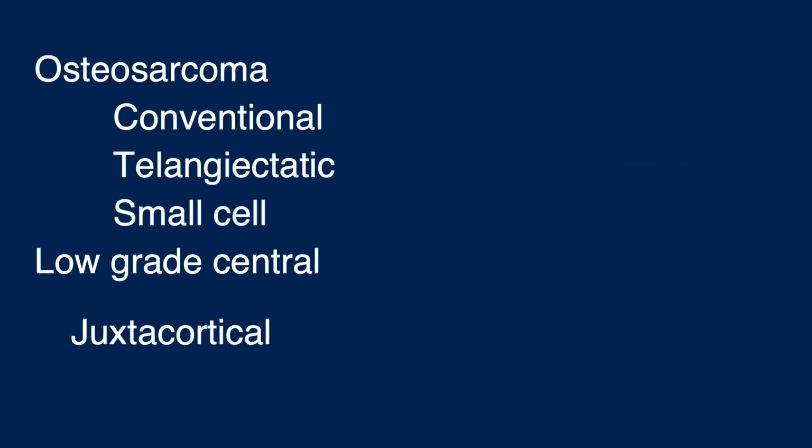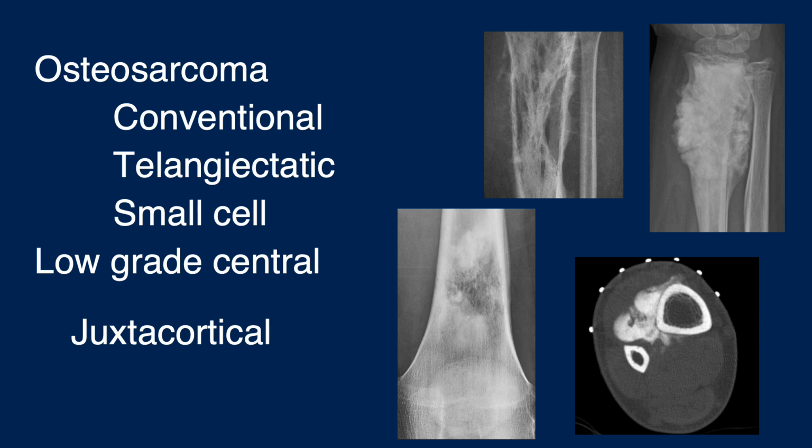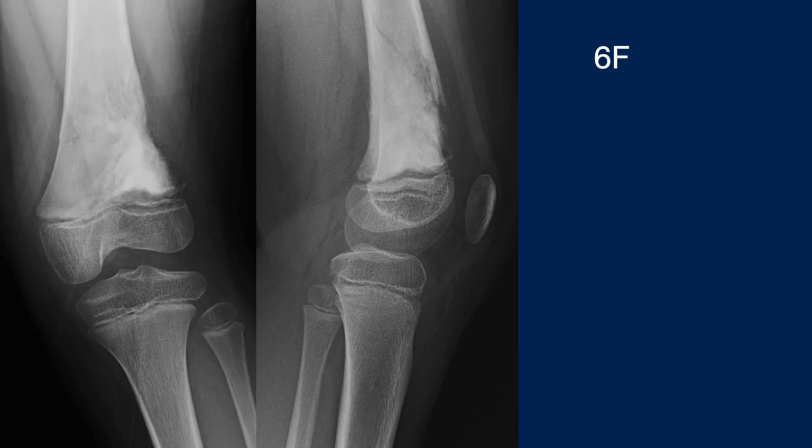While there are different types and subtypes, we're going to concentrate on the overall appearance of osteosarcomas. Getting started with case number 1. Here the lesion is aggressive appearing with a lot of bony sclerosis, extending to but not crossing the growth plate. You'll see that in osteosarcomas.